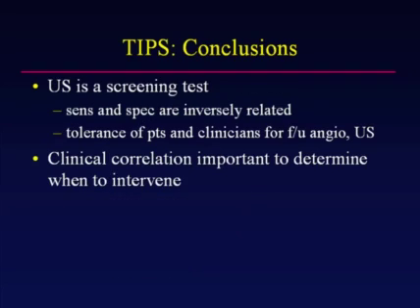In addition, you should be very concerned about change in the direction of the flow of blood in the rest of the intrahepatic portal veins. So when they initially were flowing towards the TIPS, or in a hepatofugal direction, and then they reverse, so the blood flow is now flowing towards the liver capsule, or in a hepatopetal direction, that is a bad sign.